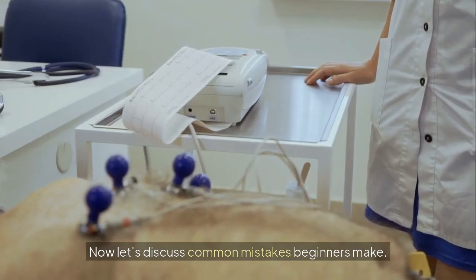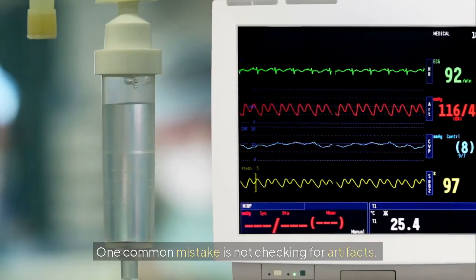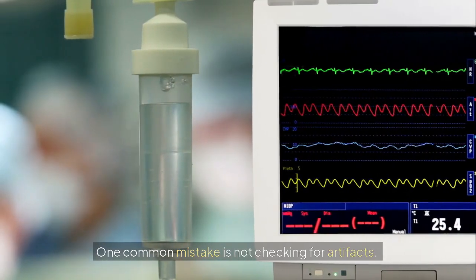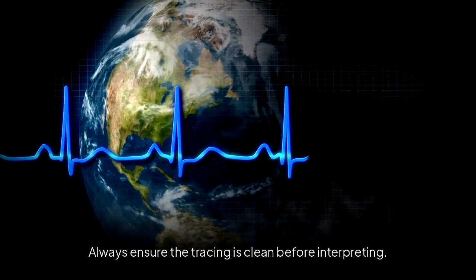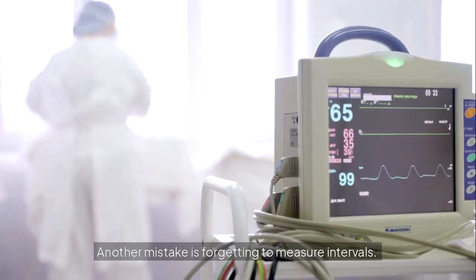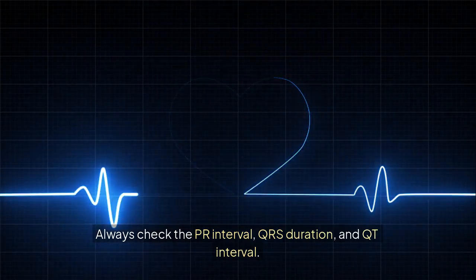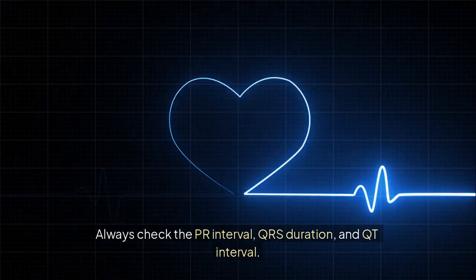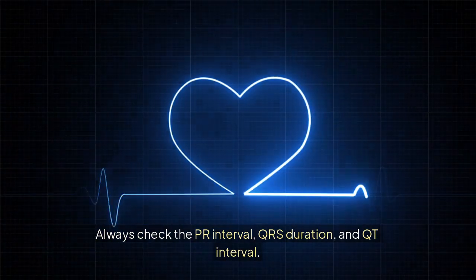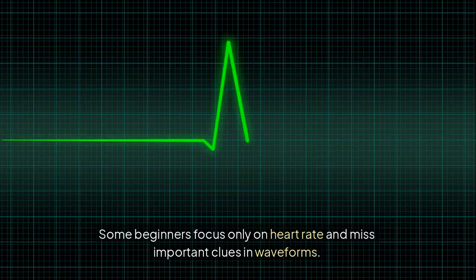Now let's discuss common mistakes beginners make. One common mistake is not checking for artifacts. Always ensure the tracing is clean before interpreting. Another mistake is forgetting to measure intervals. Always check the PR interval, QRS duration, and QT interval. Some beginners focus only on heart rate, and miss important clues in waveforms.